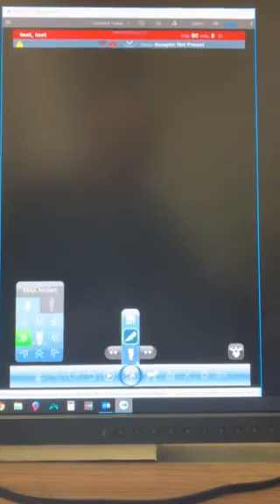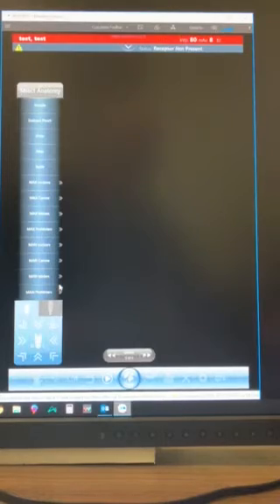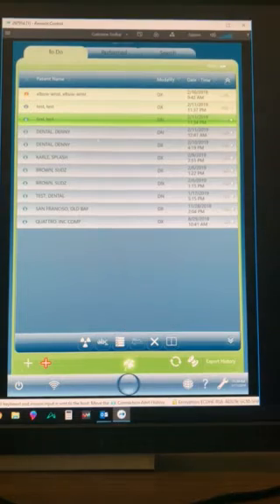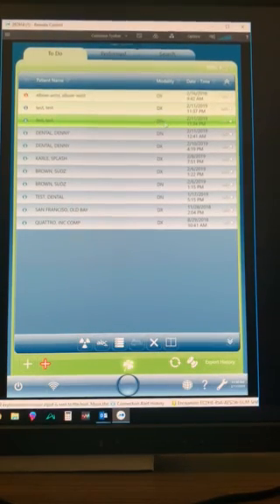And once again, if they want to switch back to the other detector, the intraoral sensor, they would hit the clover and go back to the tooth icon where we were before. When they're done taking all their images, of course, they can hit the clover and go to home. And now, when they go into the study screen, you'll see that there are two exams that are started with a patient name test, one of which is the normal DX modality for the flat panel 10x12 detector, and the other one is for the intraoral dental sensor as the DN modality.